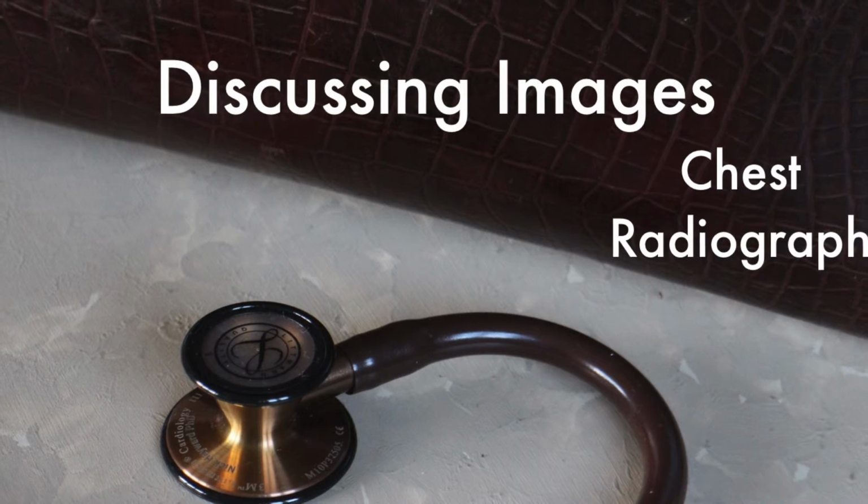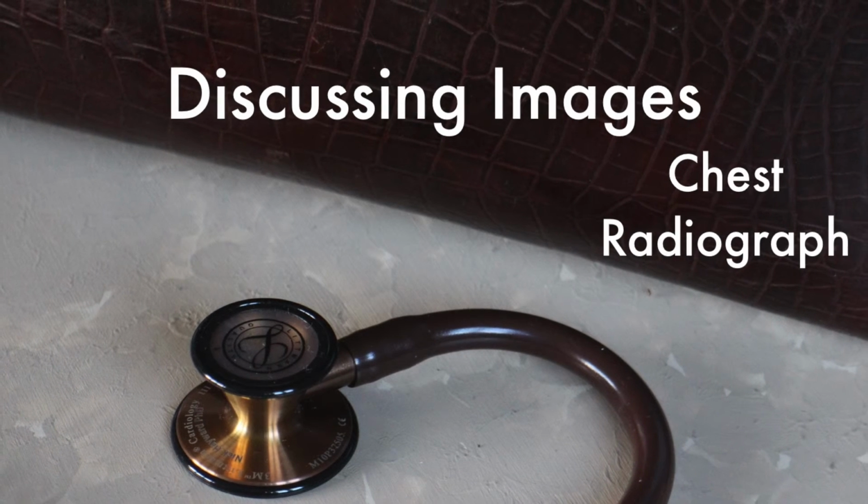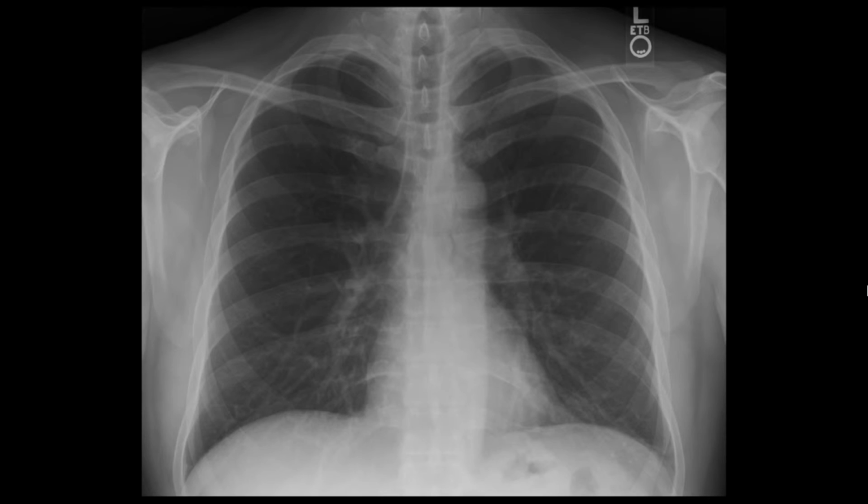Let's see this approach in action with a chest radiograph. This is a plain chest radiograph. It is a PA film. I know this because AP films are normally noted. The left side of the patient is clearly marked.